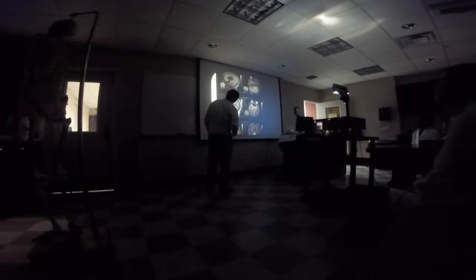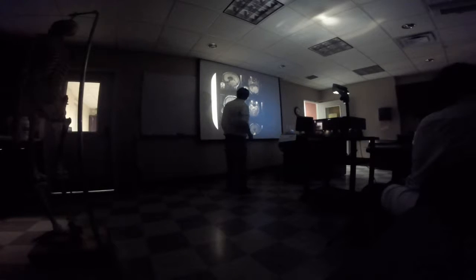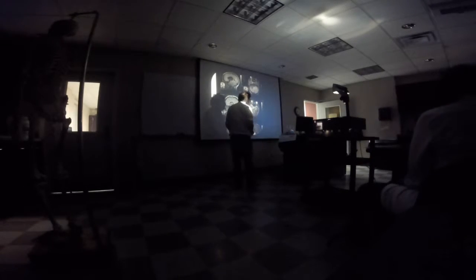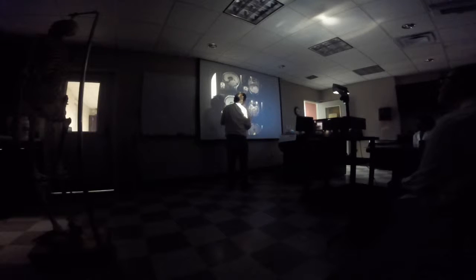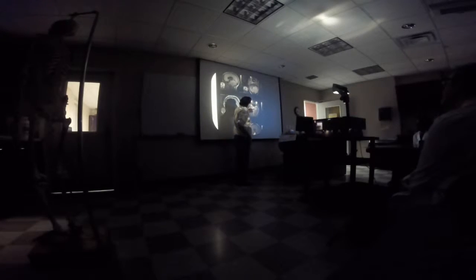Okay. What are the illuminated two spots on the image next to that one you were pointing at? The eyeball. Right here, those are eyeballs. Okay. Now, what lobes are these here? Frontal. Right. What are these two things right here and here? Oh, are those the peduncles? Yeah, this is the midbrain, so these are along the ventral surface, so that's the cerebral peduncles.